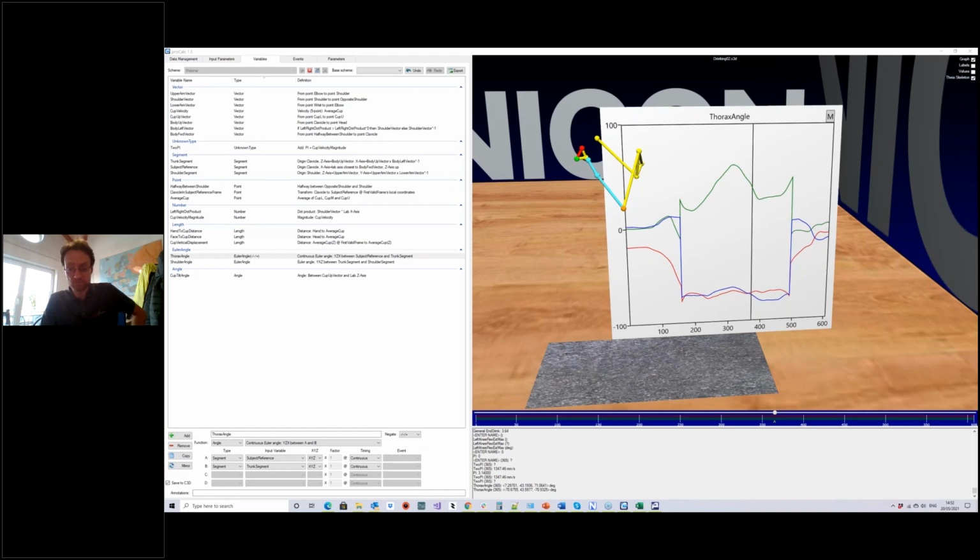But it wouldn't make any sense the other way. So you could certainly take a trial that you record in Shogun and do some calculations on it in ProCalc in order to get some parameters out, for example, but that's about it.